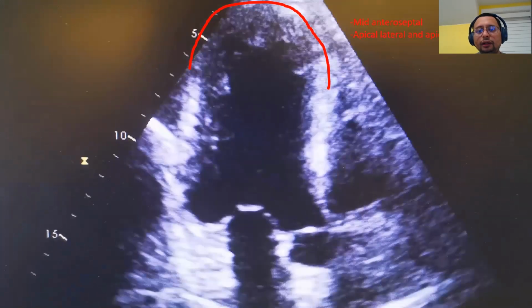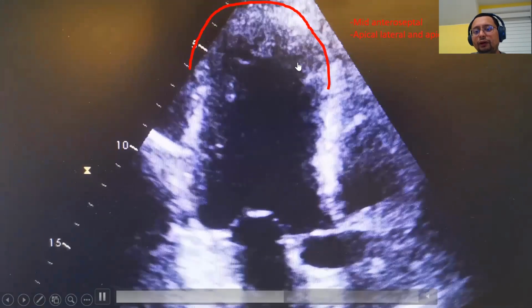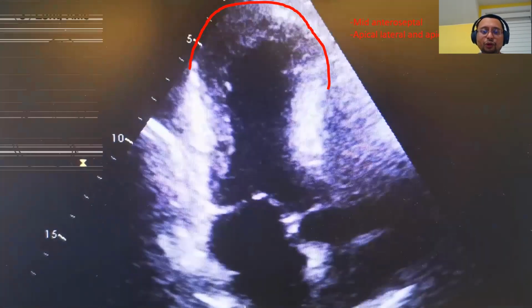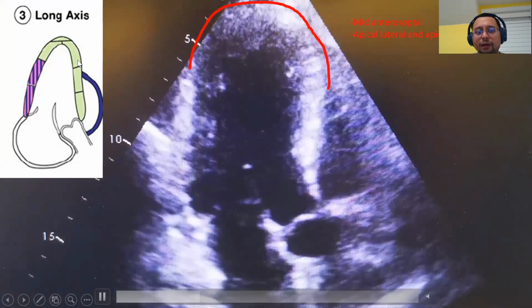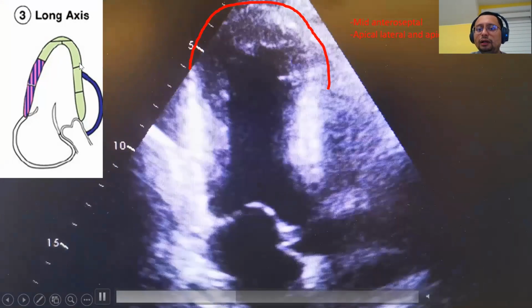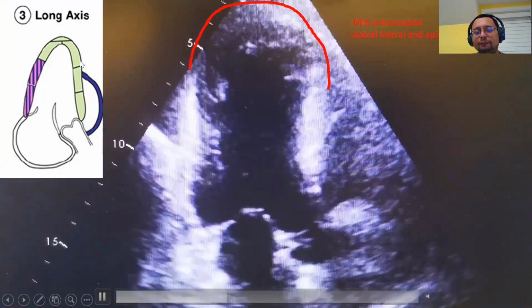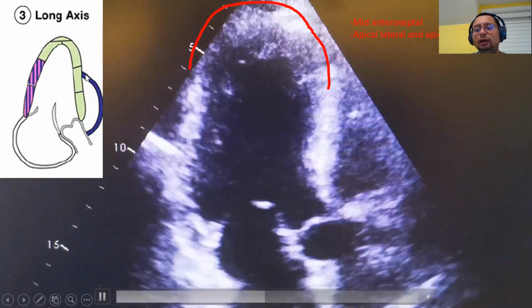Now, if you look at the region, that is apical septal and also the apical cap, apical lateral and also the apical septal of the left ventricle. If you look again at the picture of the cartoon here, you can see that this involves the apical part of the left ventricle. So that is a LAD distribution. The hypokinesia does not need to extend all the way into all regions supplied by LAD. Even if it's part of the LAD territory, we can say that this is an LAD coronary artery problem.